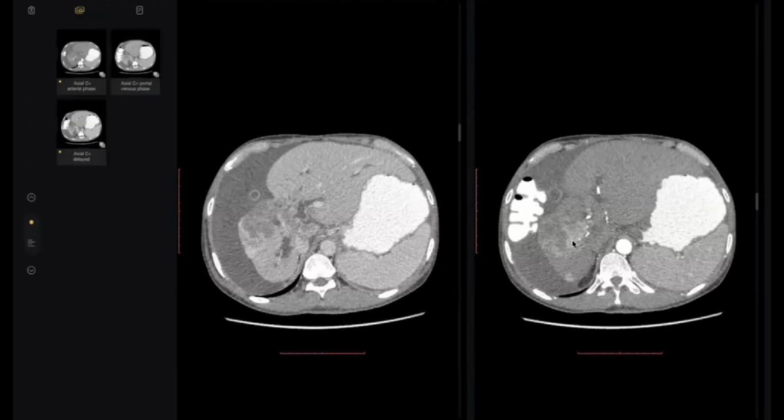Some HCC de-differentiate into mixed HCC-ICC. This is the cause. This is a type of de-differentiation of HCC to mixed type, so it is more malignant. Anyway, at least if you remark on these two different contrast uptake patterns, the examiner will be so happy that your eyes are well trained. Thank you so much, doctor.